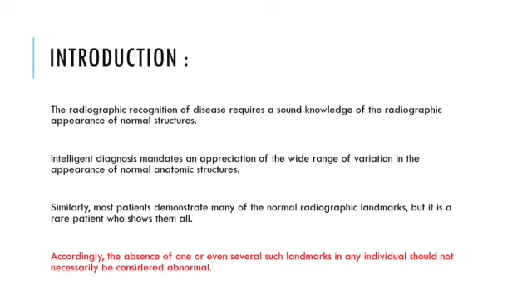Similarly, most patients demonstrate many of the normal radiographic landmarks, but it is rare for a patient to show them all. Accordingly, the absence of one or even several such landmarks in any individual should not necessarily be considered abnormal.